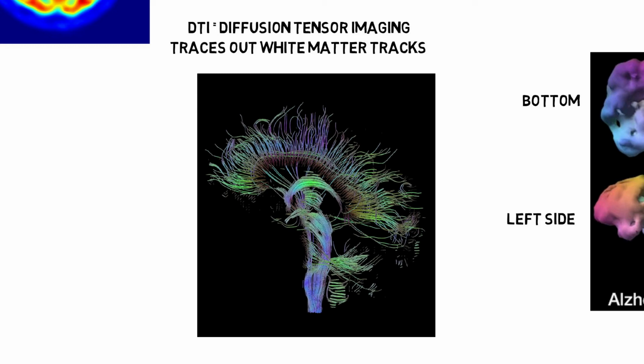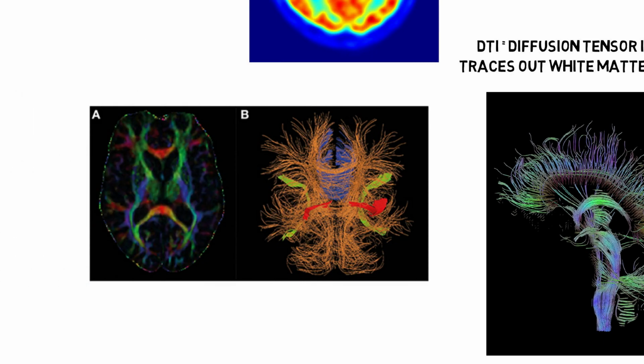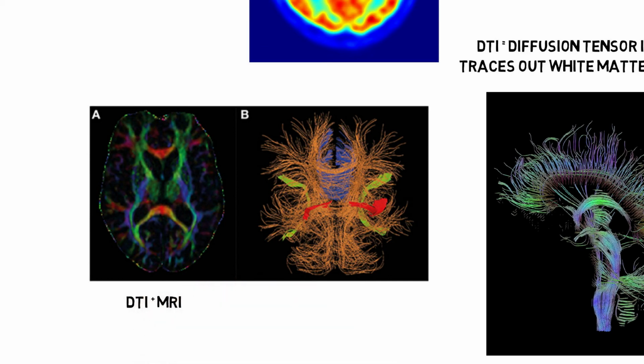This type of imaging is helpful in surgical planning to attempt not to disrupt the pathways near the area of surgical interest. Much like PET and SPECT, using the DTI as an overlay to the MRI is quite helpful in better localizing the changes. Here is a DTI overlaying an MRI and sliced in the same axial plane as the MRI, showing the major trackways in the area.